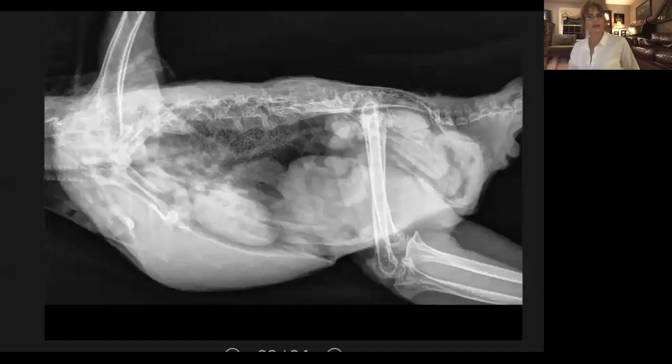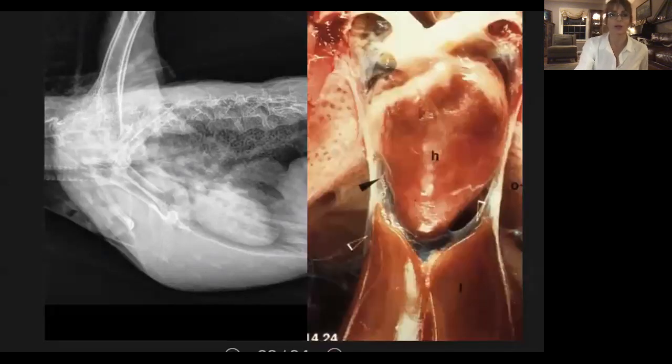Okay, so moving on, continuing with radiography, because what we're looking at are the actual airways, and because we have air in the air sacs and air in the lungs as a natural contrast media, we can actually see the lungs, especially on the lateral view on our radiographs.